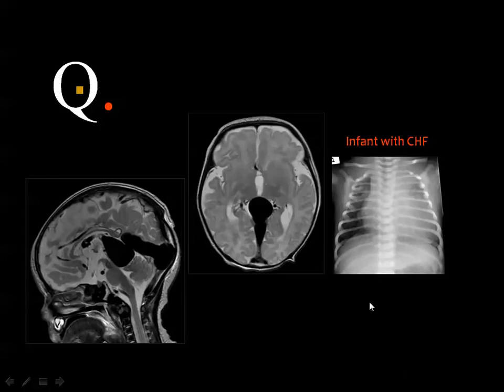failure. This malformation is not an aneurysm of the vein of Galen, as I have mentioned, and it is not a vein of Galen actually pathology. It is the vein which is the precursor of the vein of Galen, which is known as the median prosencephalic vein. There is a fistula between this vein and the choroid arteries, resulting in severe increase in the pressure within the vein, leading to its aneurysmal dilatation.